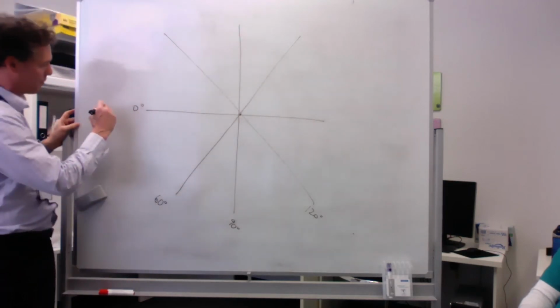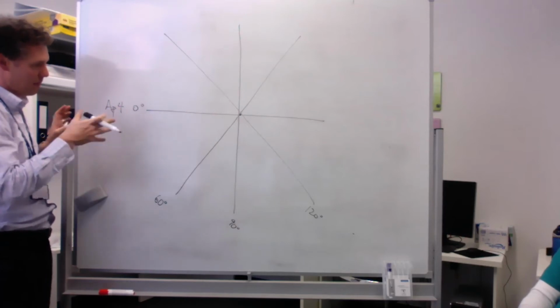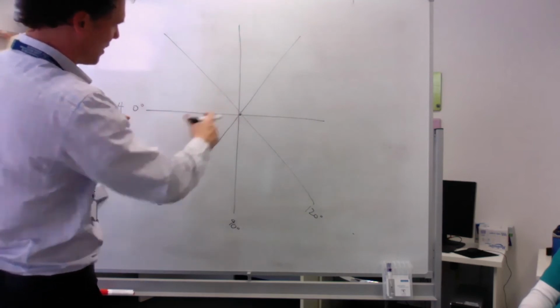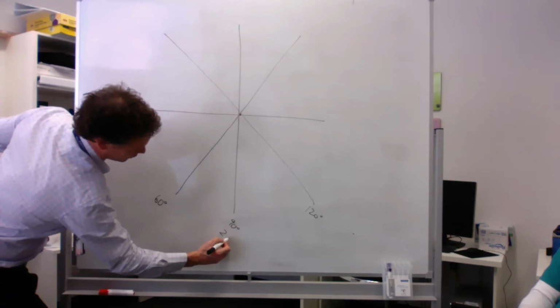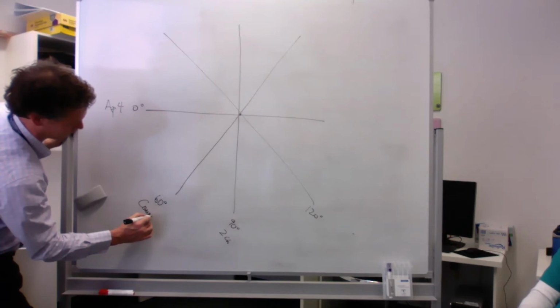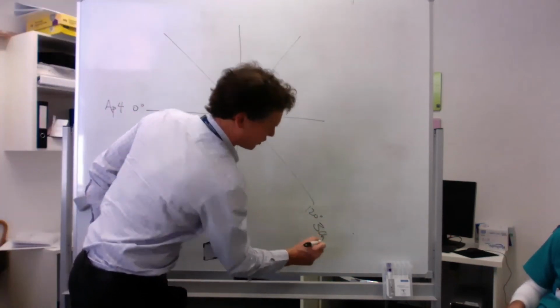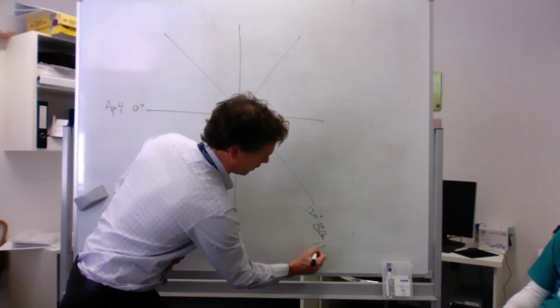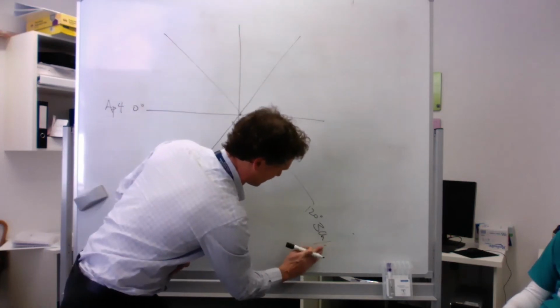But if we remember our TOE picture, this would be the apical 4. Yeah? And remember, from your apical 4, you can get to your 2-chamber by rotating it about 60 degrees. I think in the textbooks they call 90 degrees the 2-chamber, and then this is your commissural view, yeah? And then this 120 would be your 3-chamber view, right? That's also the same as your parasternal long axis.